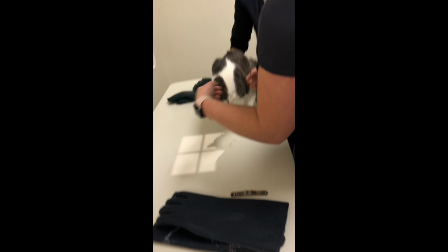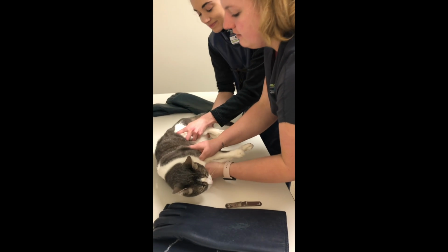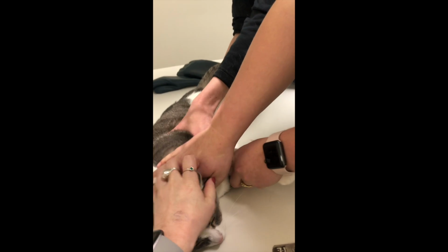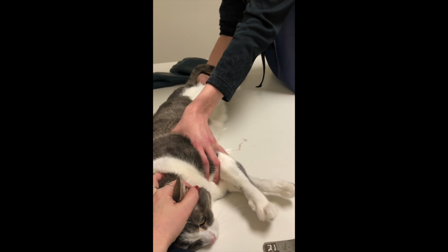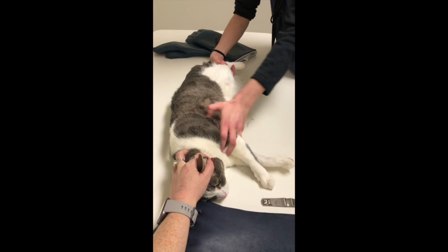Negative contrast mediums are low atomic number or low density agents like air, nitrous oxide, oxygen, and carbon dioxide, causing them to appear darker or radiolucent. A disadvantage of this is that there is less mucosal detail, and you must be careful to not overinflate organs such as the bladder. Before taking your radiographs, measure the patient in the positions needed for the films.